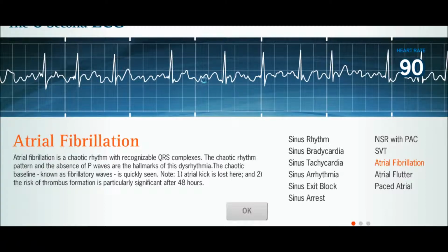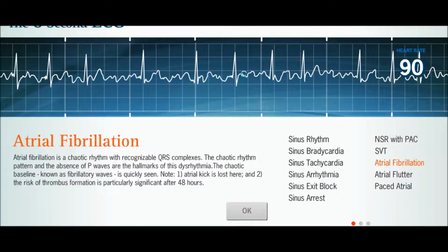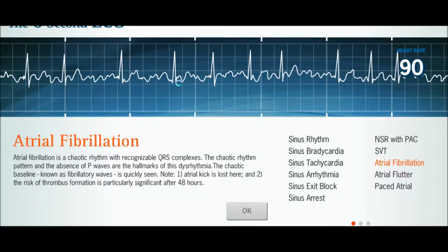but yeah, this is AFib, and it's characterized by crazy little squiggly lines here on your equipotential electrical line, followed by random QRS complexes. It's a pretty straightforward thing. Can be non-pathologic. Typically, people are treated with a blood thinner or anticoagulant.